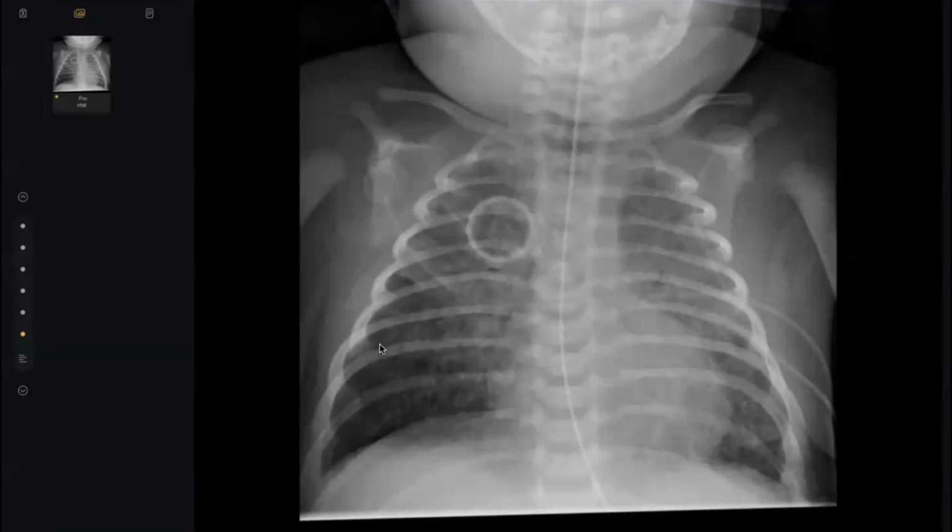Pneumomediastinum and/or pneumothorax. This is very characteristic. If you want to be 100% sure this is meconium aspiration, number one, ask about the history. You are correct. Number two, either signs of hyperinflation or signs of pneumothorax, pneumomediastinum. Very characteristic.